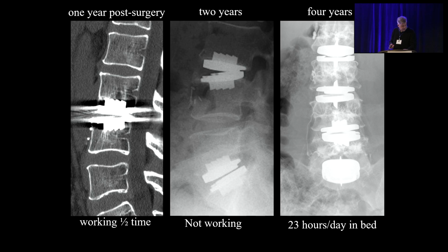Okay, so this is where the problem really starts. They can be due to those things, but most of the time it's not. This is a patient who was actually UCSF faculty, classic academic triple threat. She was an awesome clinician. She ran programs. She was a researcher. She developed back pain.